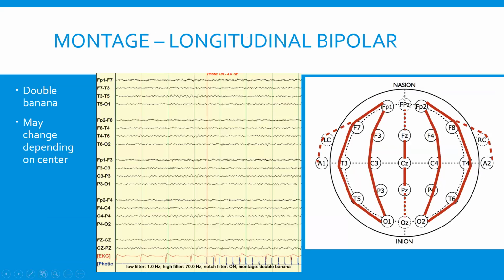So here it's the same diagram of the electrodes, and now we're going to translate these electrodes into something we see on the page. This is something called a montage, and if you watch the bedside EEG, this is a montage we use. A montage is basically how we get electrical signals by comparing different electrodes.